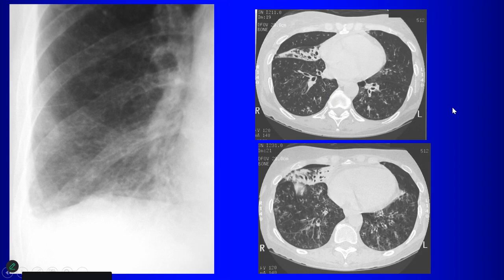And here's the CT scan on this patient. What do we think? It's a consolidation. There are some patchy opacities there, right? Consolidations with some air bronchograms. Anything else? Is there bronchiectasis? Yeah, there's bronchiectasis, right? So we see bronchiectasis, parabronchial thickening, right? And what about these kind of ground glass nodular opacities? What do we think those represent?